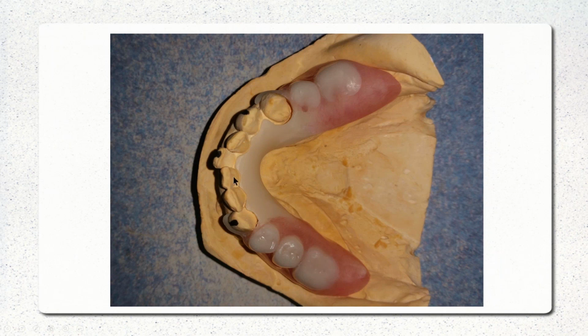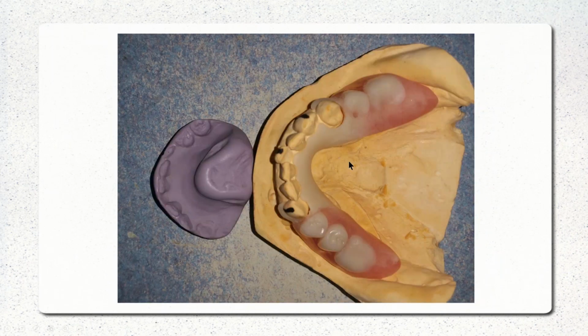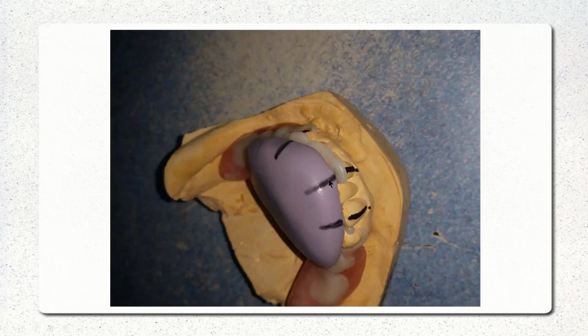What you're going to do is fill that area in with wax and then do a putty matrix over that area, like you'll see here. That just encompasses that. Clean all the wax off, get it nice and clean. Again, you're going to take the torch and go along here, heating, following it with the gun, putting a bead of material along there. Then you pick up your putty matrix and smash it into place. Again, you want material to be oozing because that means it's pushing it into the finer details.